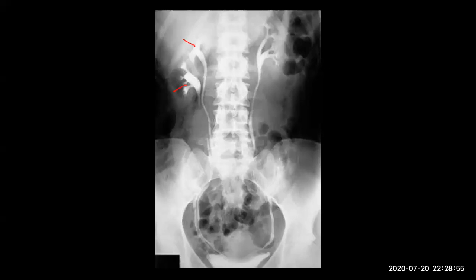In which one, the upper or lower moiety, is the ectopic orifice? The upper moiety has the ectopic orifice, okay? And the upper moiety is also prone to obstruct, and it is medial and inferior to the lower moiety, okay?